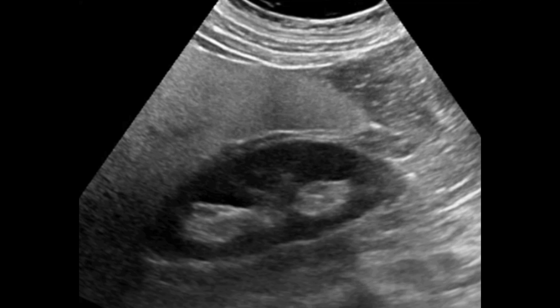So just quickly, kidney size is not difficult. If you can see the kidney, there's that question, chronic versus acute. I know maybe you're not that worried about kidney size, but if it's an internal medicine patient, it does make a difference. If you have a patient with renal failure and goodness, the kidneys are small, so they've got underlying chronic renal disease. Unfortunately, the ultrasound's not going to tell you the creatinine, but it's close. You can make an estimation. So that is a useful question, isn't it?